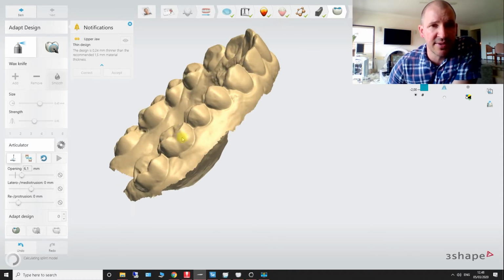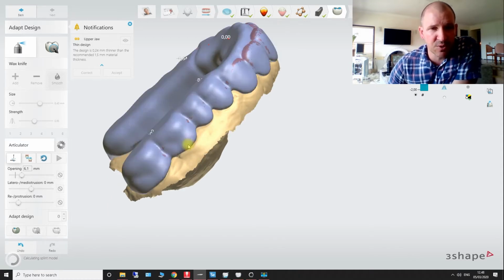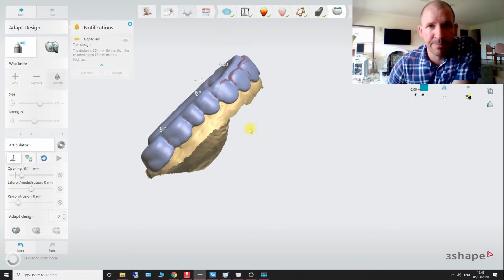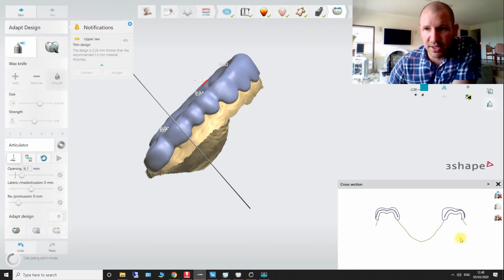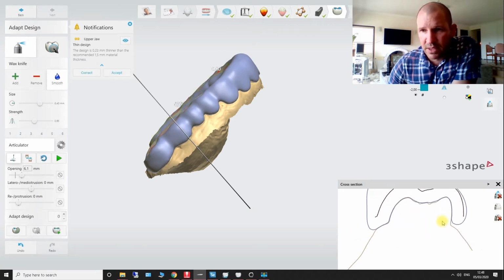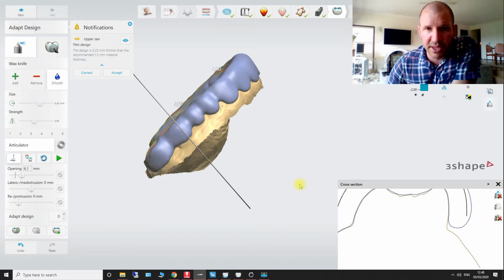If you choose the standard 2 mil, what happens is the actual thickness. So if I were to use the slice tool now, this is just me doing my editing. If I were to come in here with this slice tool, can you see we're just starting to engage the undercut down through here, right?